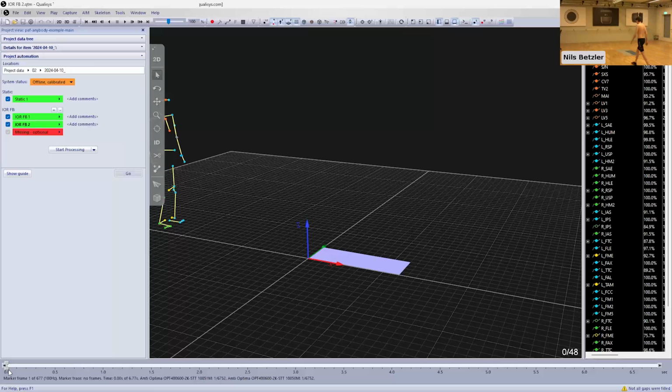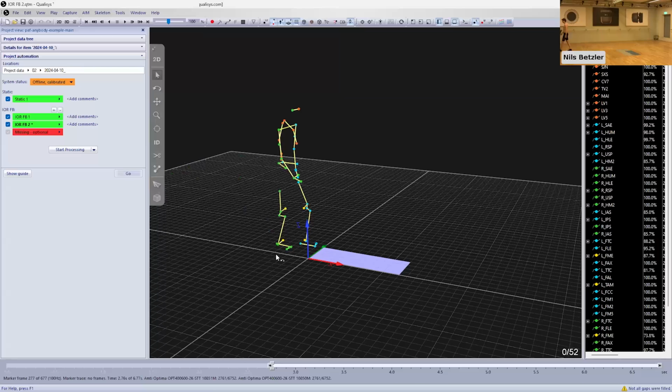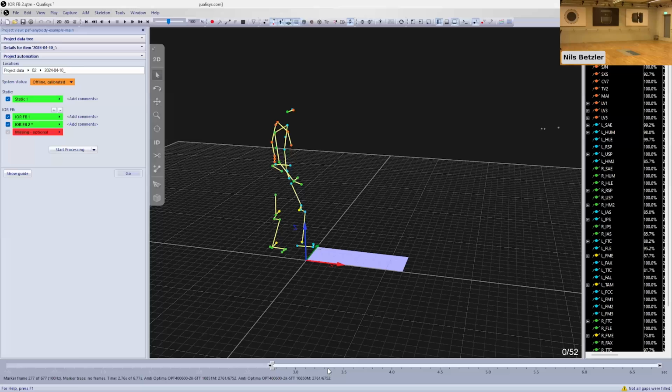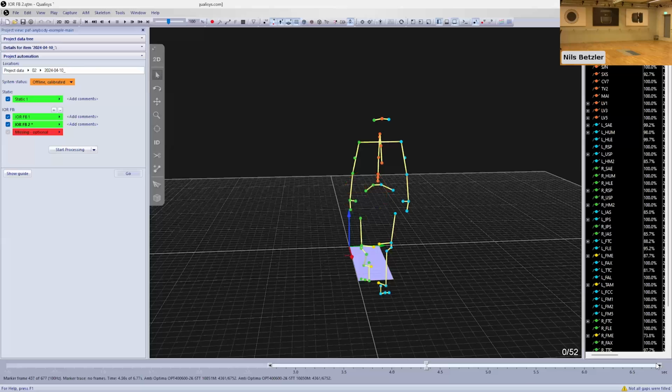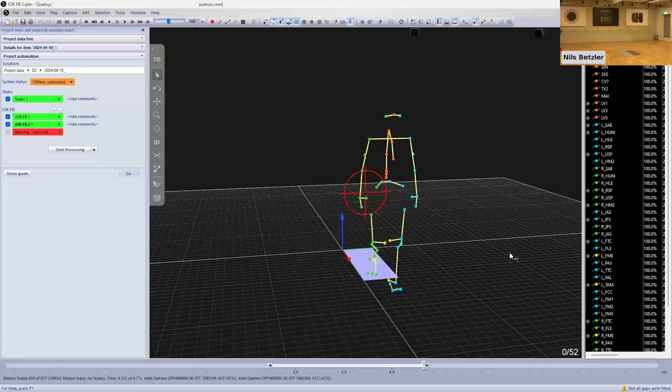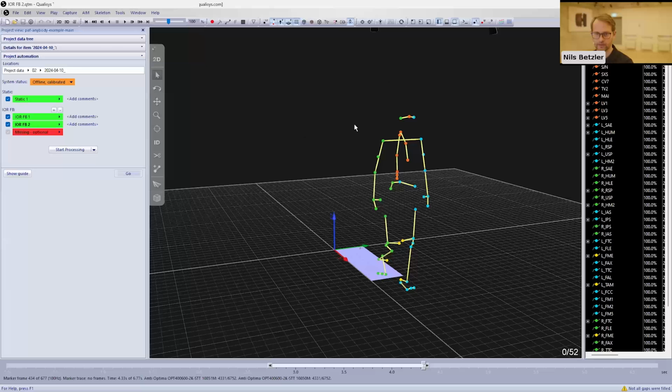Okay, same procedure. Just go here, make sure we've got 100% labeling. It's looking good. Then we crop here. You can also see on the fill level on the right-hand side, that's a good way to check that all the data is fully visible. That after I crop the file, we've got 100% everywhere. It was only when my colleague was entering the volume that there was a little bit missing.